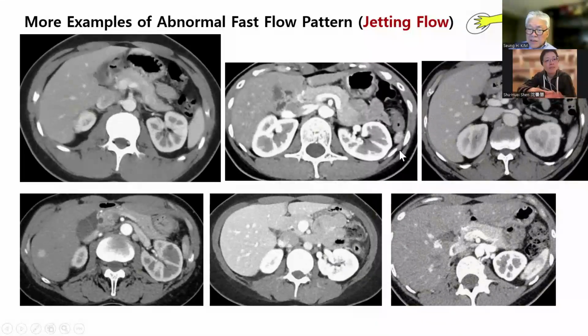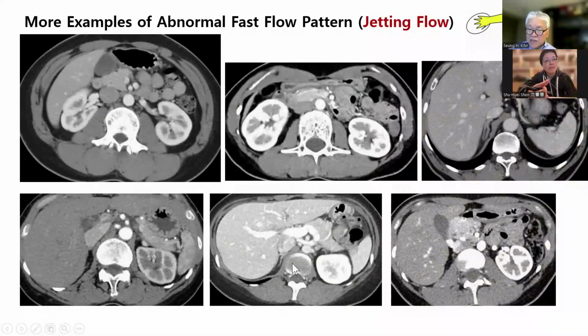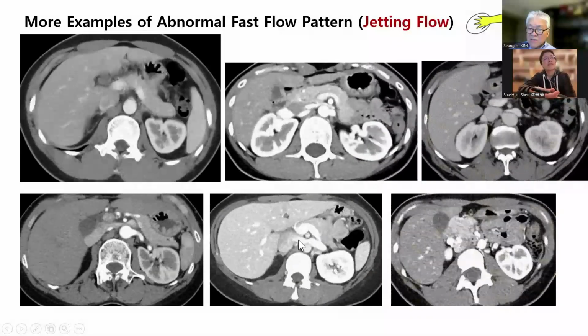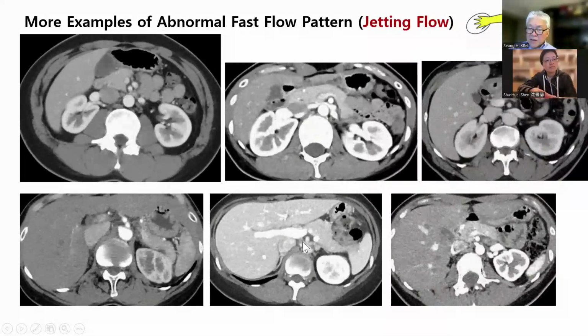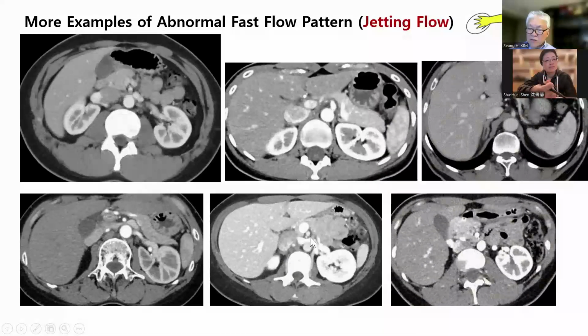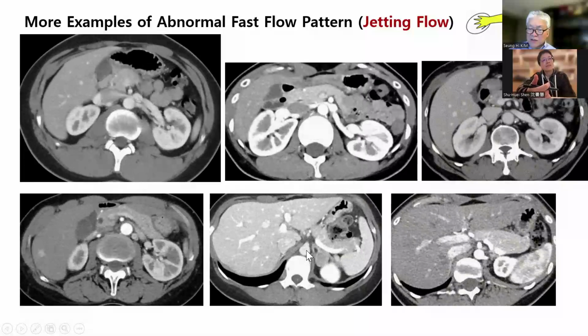It's something like the contrast is spread in this inferior vena cava. It means that there is some compression point around this area.